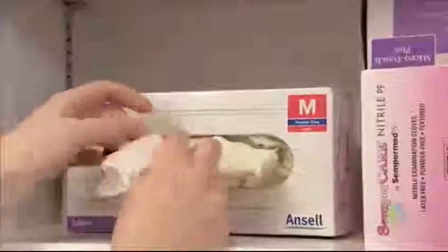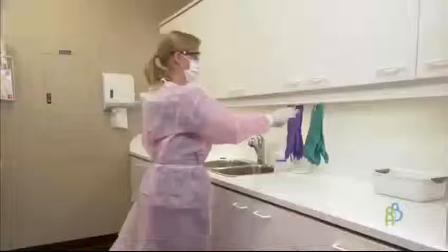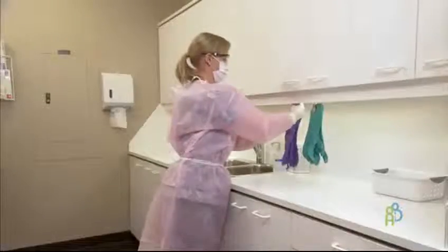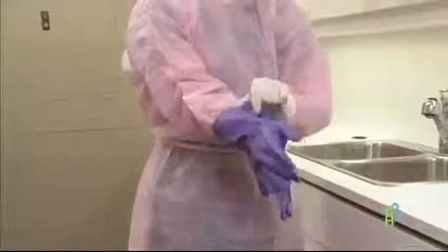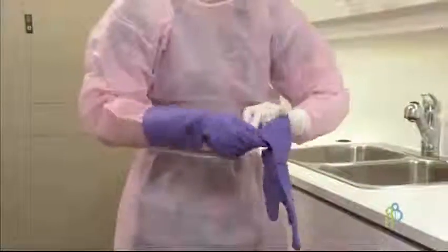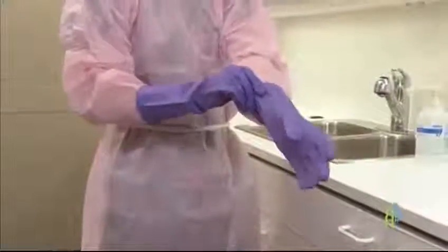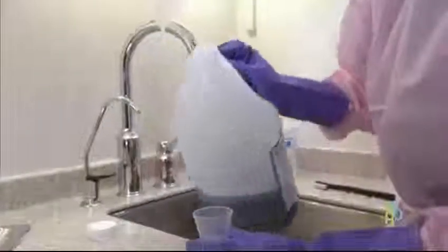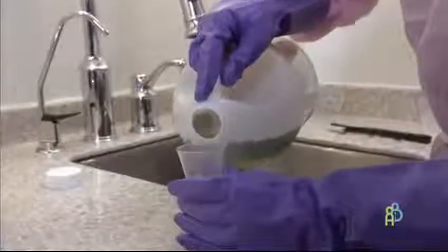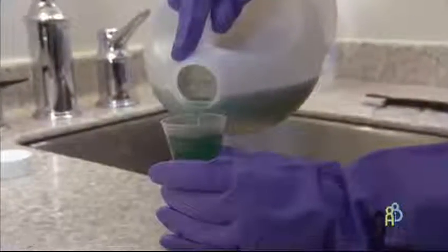Procedure or examination gloves provide insufficient protection and are not suitable for handling soiled devices or chemicals in the reprocessing area. Gloves used in reprocessing must be chemical and tear resistant with a cuff that extends up the forearm. Gloves selected for use can be single-use disposable or they can be reusable. If reusable gloves are selected, they must be used by only one person, and a method of labeling them must be developed.